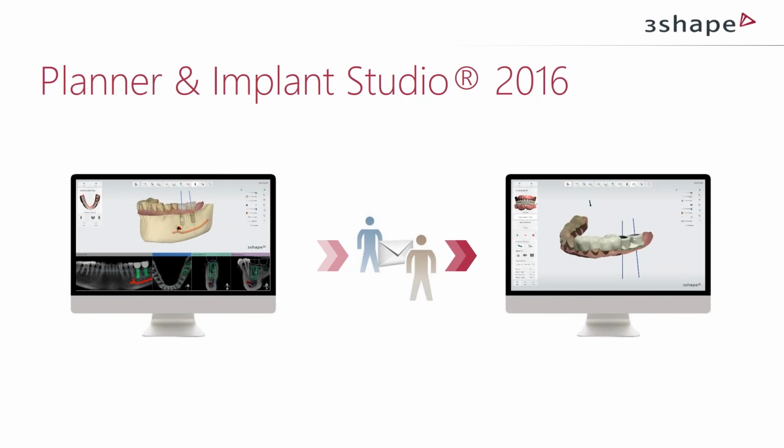but also the expectation of the clinician, the surgeon, and still leaves the flexibility to consider maybe some experience from a lab technician. So maybe you can show us what a typical guide looks like. We normally see on trade shows or have been presented by us, and then we take it from there on what are the different things we can play around with.